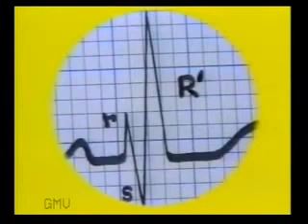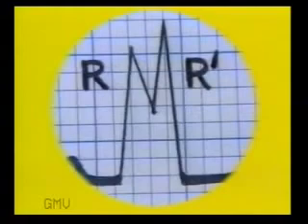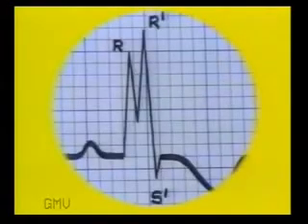This is a RSR dash with a tall R dash wave. This is a RR dash pattern. And this is RR dash S dash pattern.